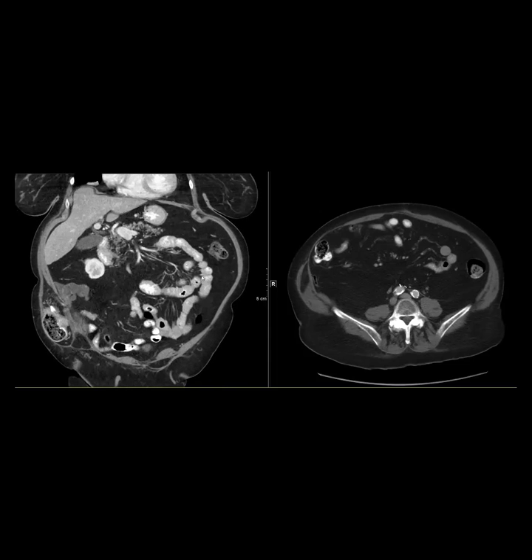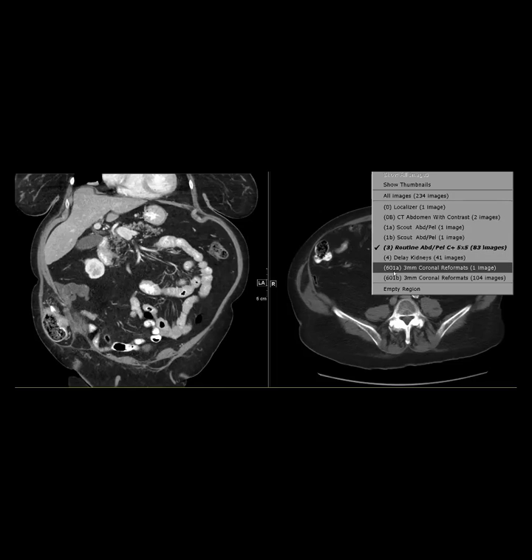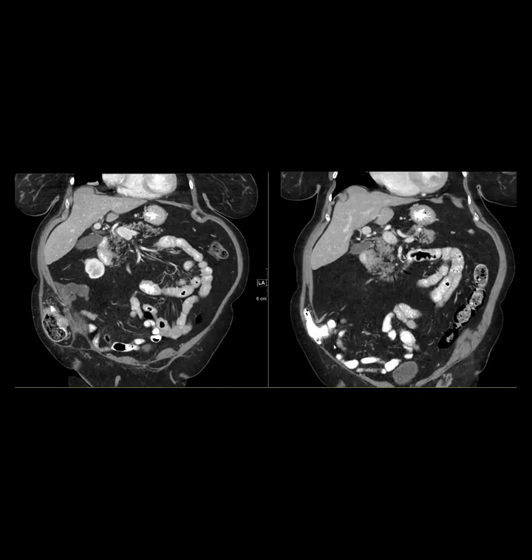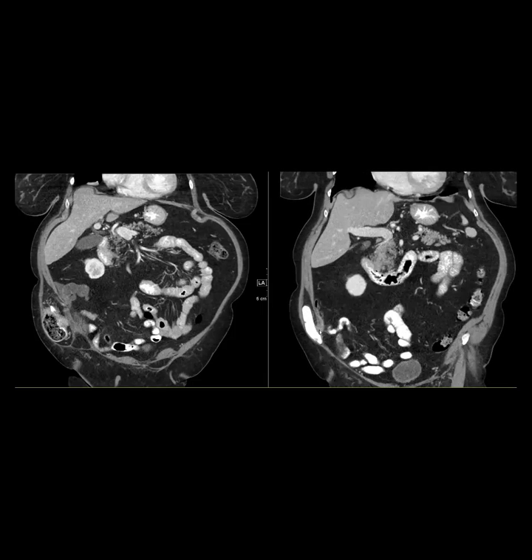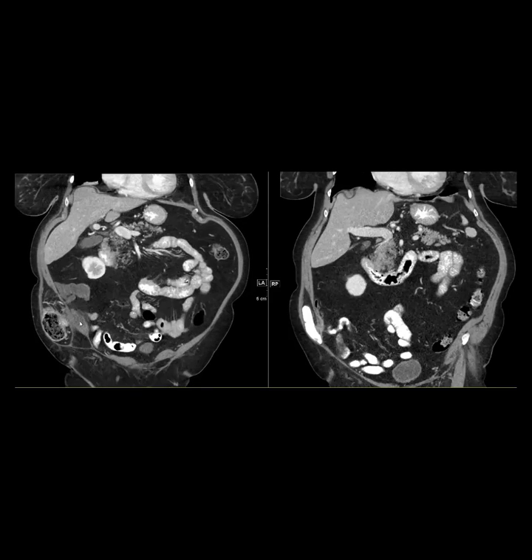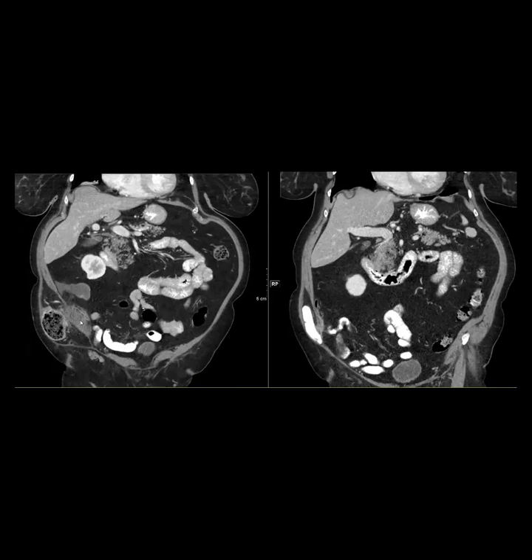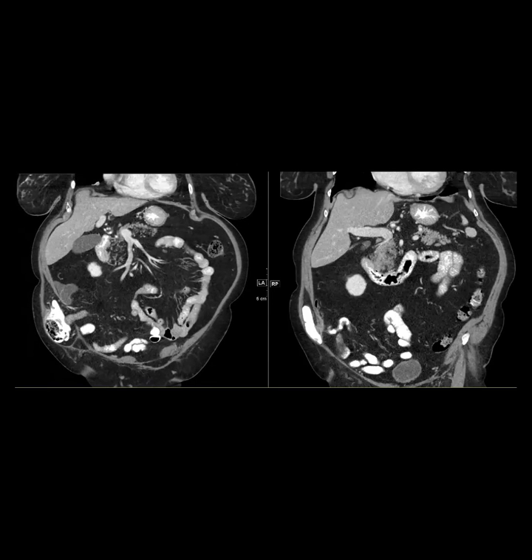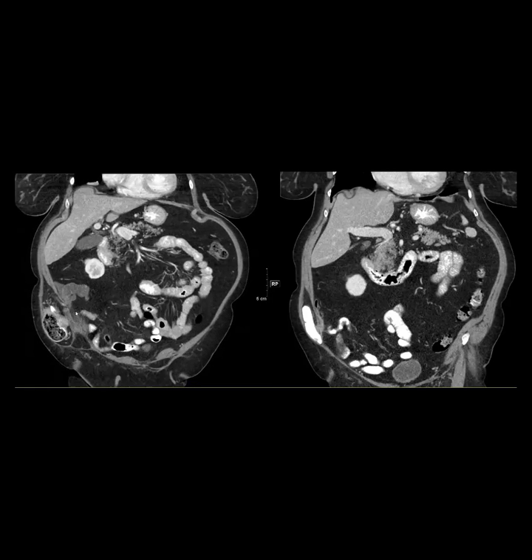That's very cool. Yeah, that's cute. The path is all benign, right? Yeah, it was all benign. I don't remember if there was also superimposed inflammation. It may have been. This is what it looked like 5 years before. This is a cute case. Do they have to take it out, Victoria? I think at this point it was symptomatic and there was superimposed inflammation, so I think it also had a little appendicitis situation happening.